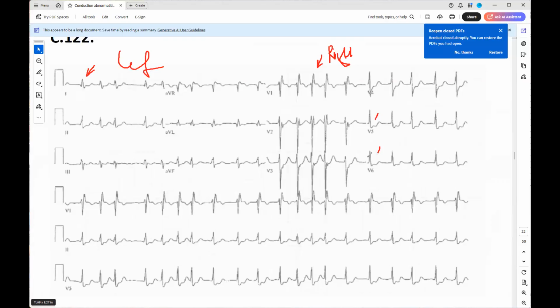Whenever the ventricle activation time is elongated, the block is there. But it's a typical one. This is an RSR pattern, okay? This is the M phenomenon. So that's a right bundle branch block, okay? So we do have a right bundle branch block.